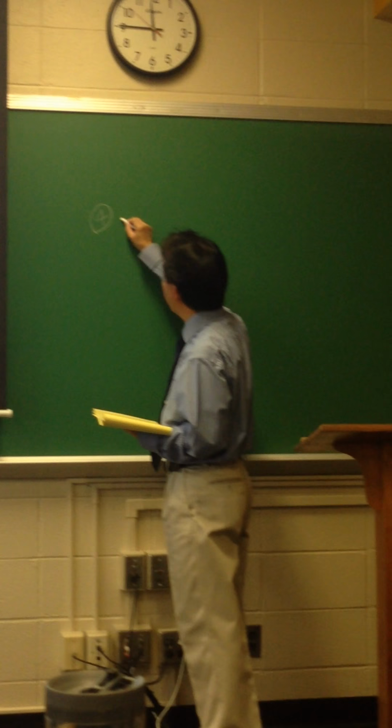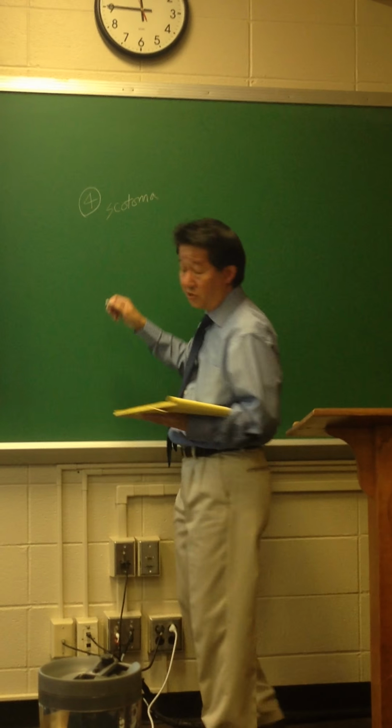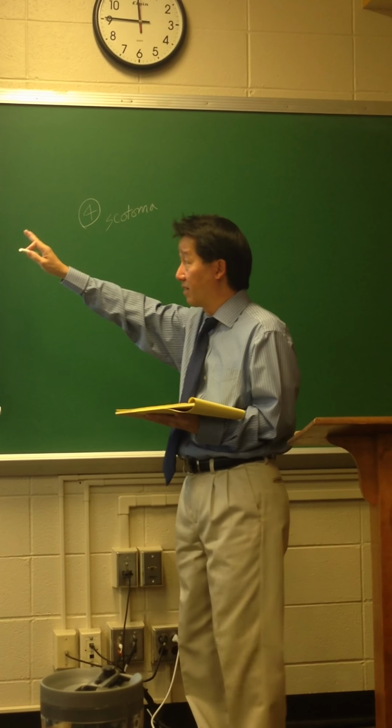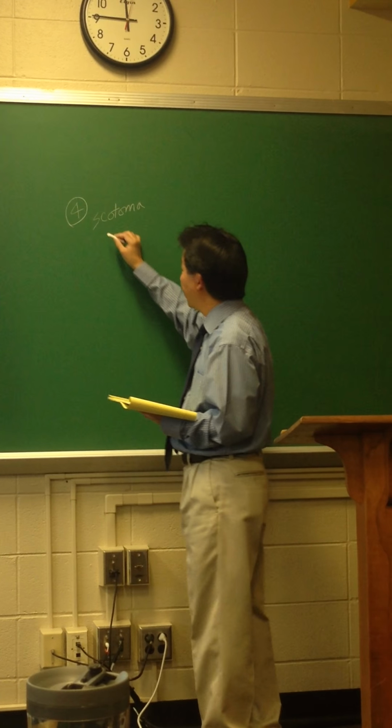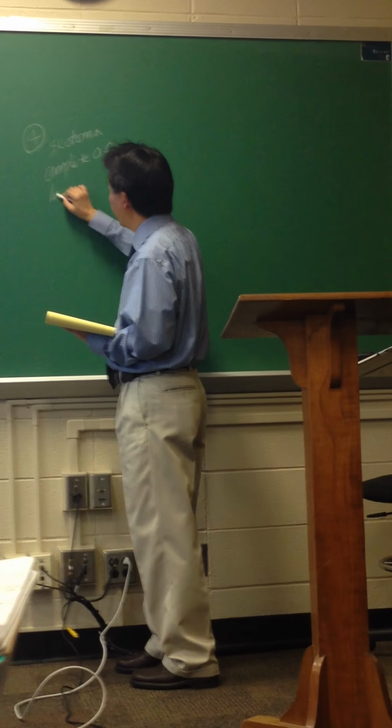Here's where you have an absolute scotoma. So scotoma is absolute, no light sensitivity. It is zeros or less on this readout here. And that could be from, you know, complete optic atrophy, say, or late glaucoma.